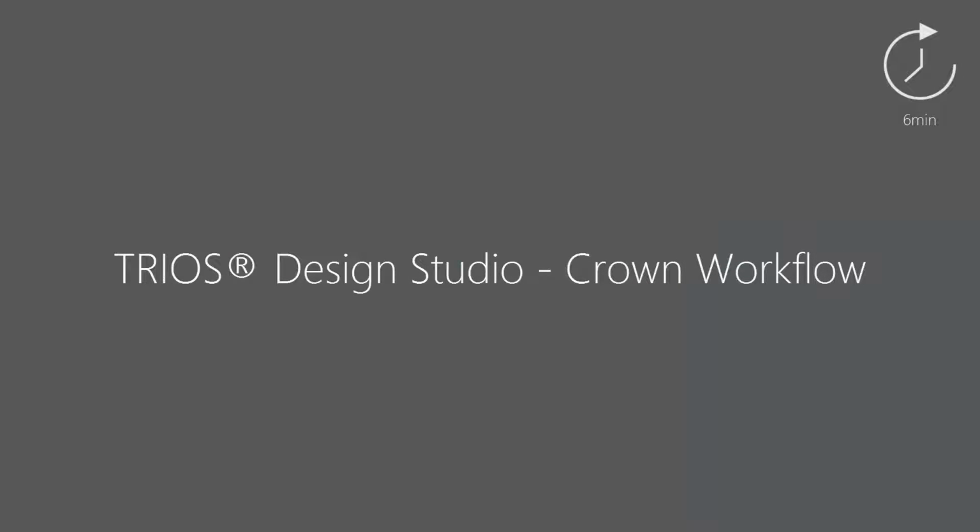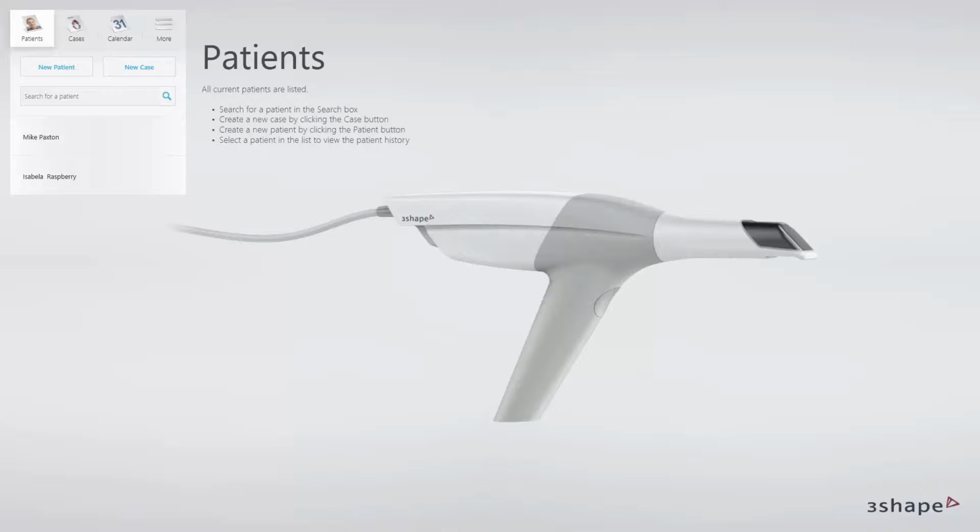In this video, you will learn about TRIOS Design Studio crown workflow. The TRIOS Design Studio solution is a complete digital workflow with fully integrated CAD/CAM modules. This solution is dedicated to dental practices that would like to produce restorations like crowns, inlay onlays, veneers, and bridges in-house. Start with creating a new patient.